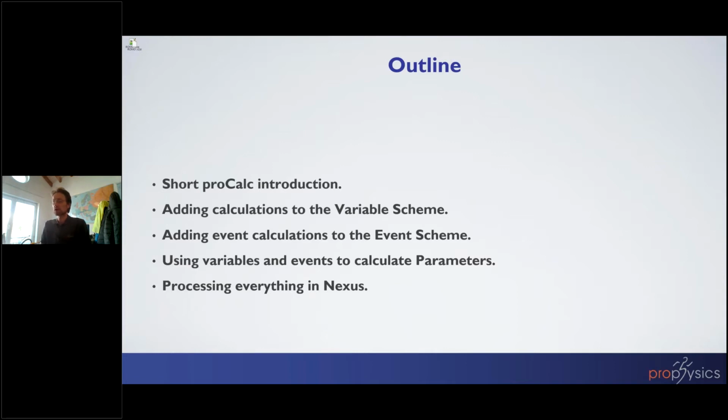We're also going to add some variables and events. We're going to use the variables and the events to calculate some cool parameters, which we will then process in Nexus and have a look at, and maybe even Excel if we're lucky. So hopefully that sounds good to everybody.